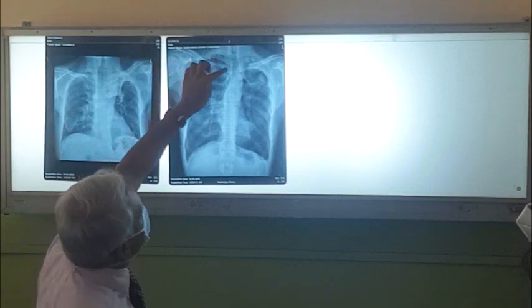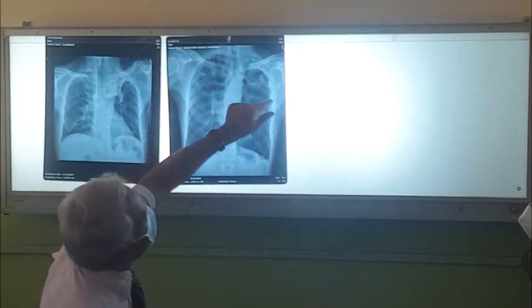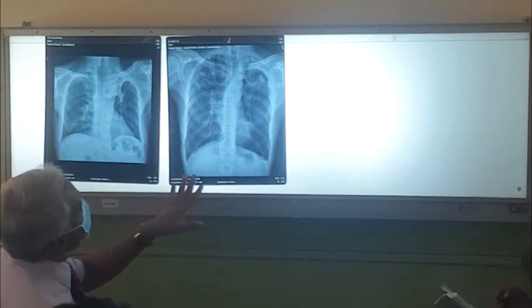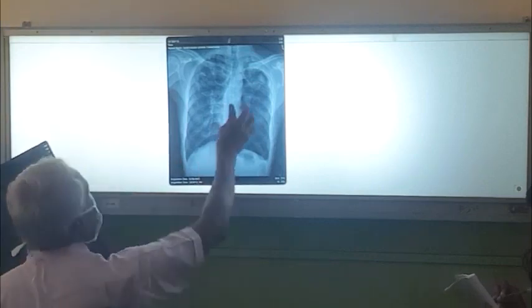So these are all cavities, and this is a pleural thickening here, and this is a cavity with intracavitary body. So you have to think of mycetoma. So patients with TB, when they cure, later on they can come with hemoptysis, and you have to do X-ray and see whether they have mycetoma in addition to reactivation, right? Mycetoma and malignant formations.